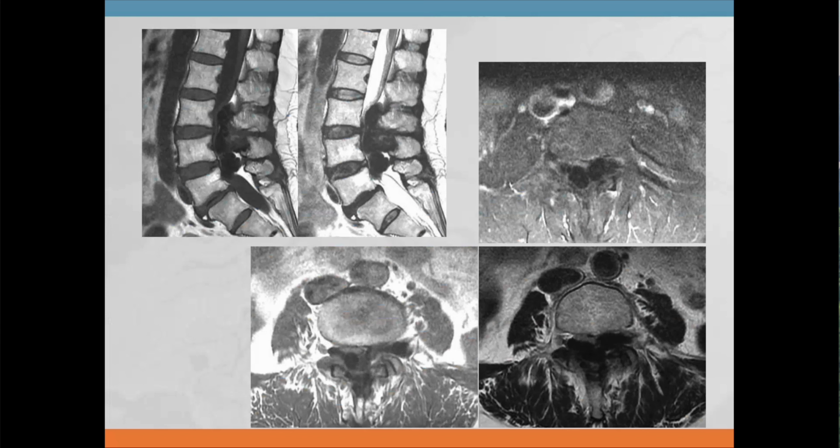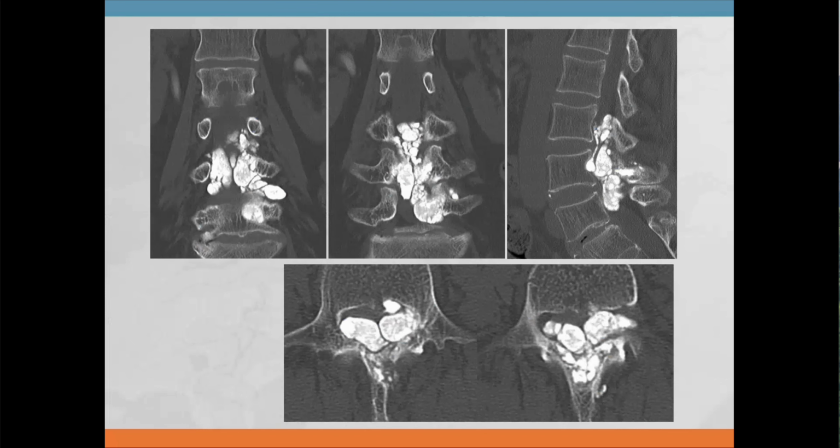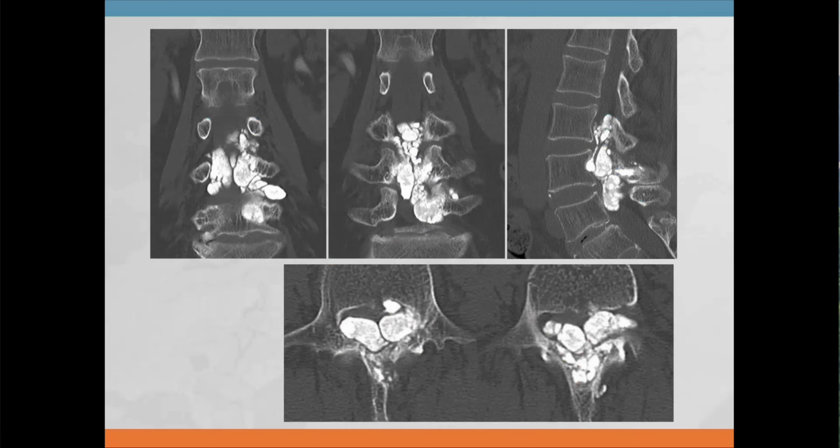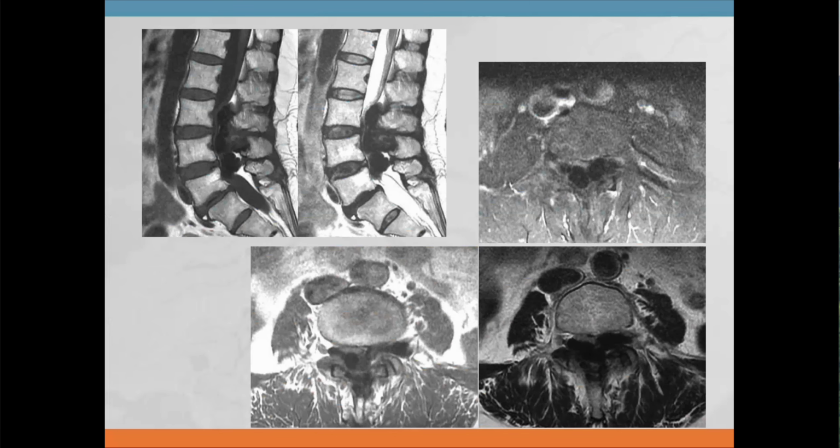Okay, okay. So you think this is? Was that a myelogram? Old one? No, this is just a straight CT. This is all calcium, John. This is all this calcium deposits in around where they injected. I have a feeling they injected it. I don't know why. Yeah.